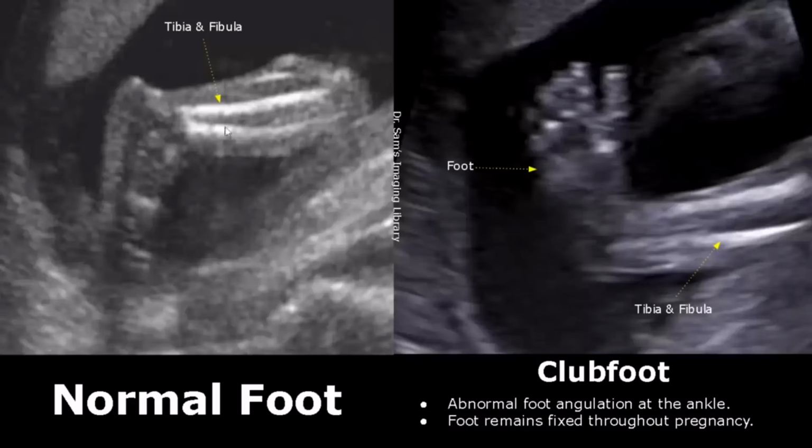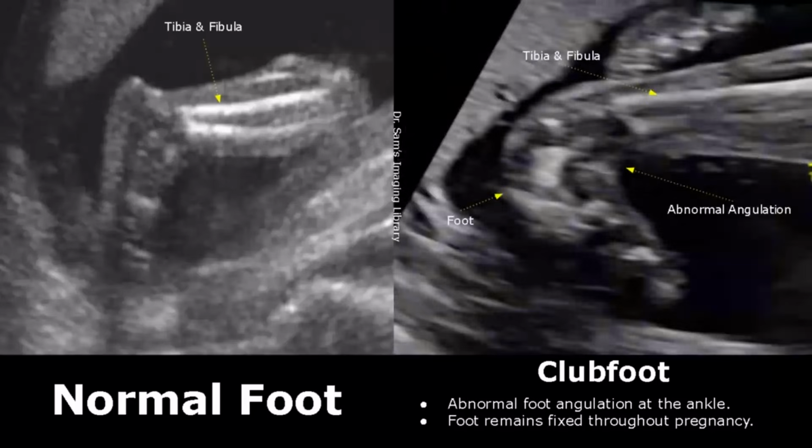This is the proper alignment of the foot, whereas over here it appears curved at the ankle region. The foot often remains fixed in this position throughout the pregnancy. Here is another image of a club foot. The abnormal angulation is more severe in this case.